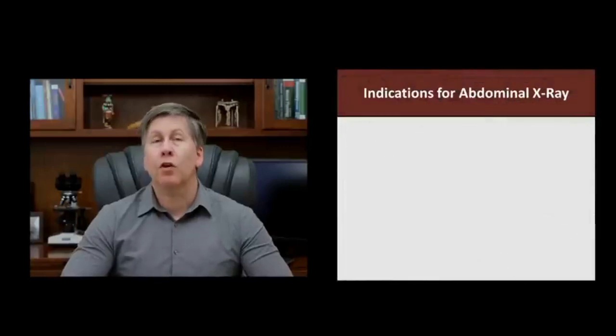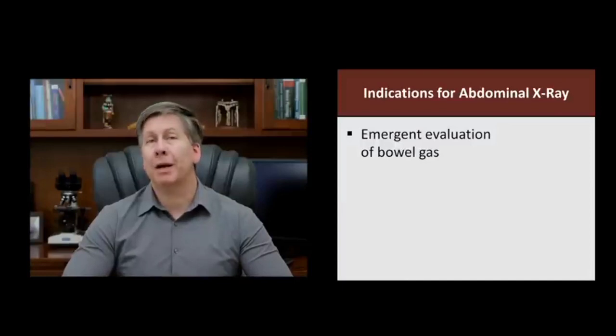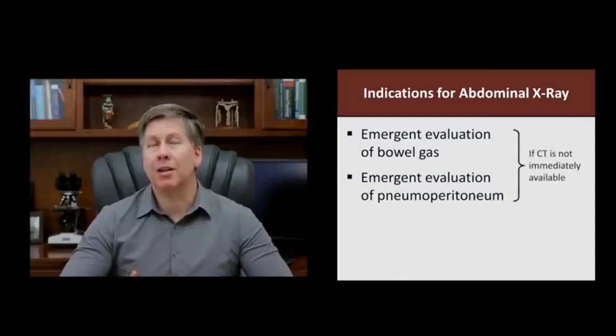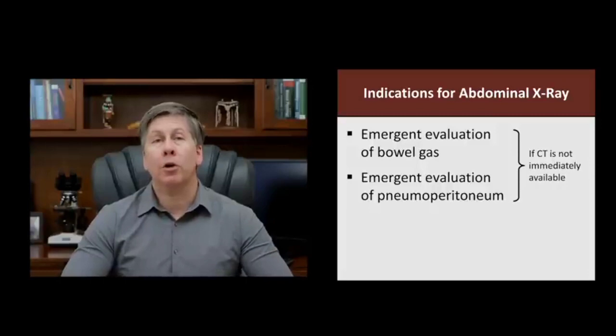I want to make it clear that constipation is a clinical diagnosis. It is true that you can see stool in the colon on abdominal x-ray, but the colon is designed to hold stool. Most people are going to have some stool there. That being said, there are actually published grading systems for fecal loading, classifying fecal loading as mild, moderate, or severe. However, studies looking at abdominal x-ray and constipation in general have shown poor inter-observer reliability and ultimately conclude that the abdominal x-ray has limited utility in evaluating for constipation.